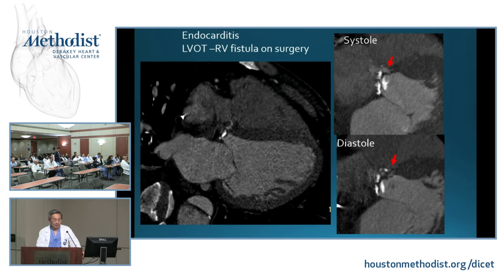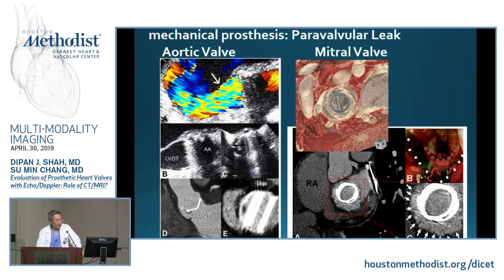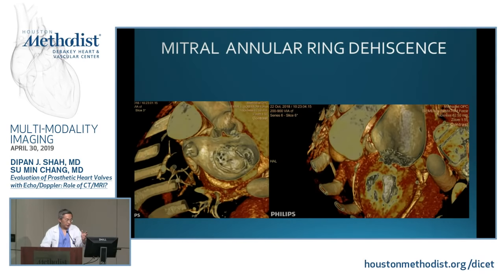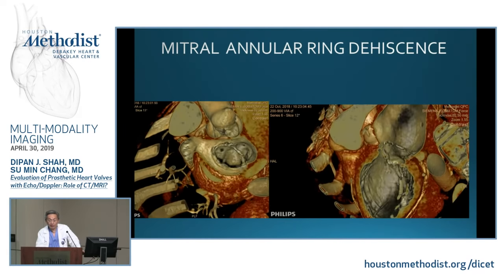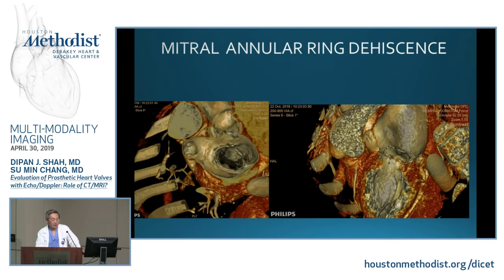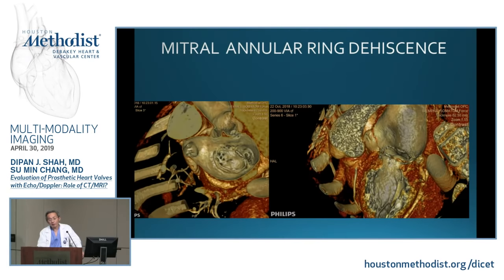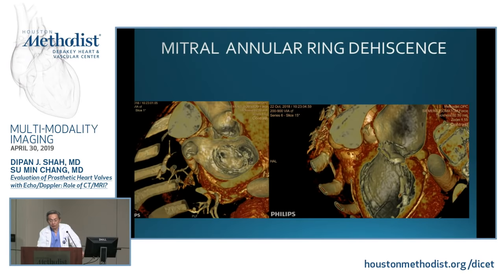I'll show you some data, some very limited. Okay. Yeah. So regurgitant lesions, again, this is just some show and tell of dramatic cases of paravalvular dehiscence that we can see. But one thing I want to bring special attention to is when we encounter patients with mitral regurgitation who have had a surgical ring put in, and the patient ends up with the mitral annulus and surgical ring dehiscing. Sometimes we call it paravalvular leak, but that's truly not the case because the regurgitation is from the original regurgitation.